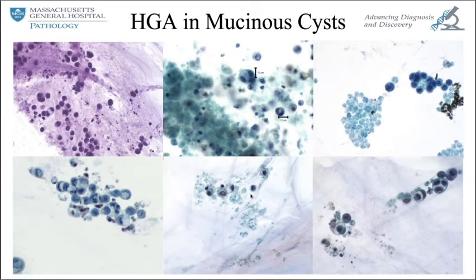What if you have a similar situation to this case that you're showing now? You have a lot of necrosis in the background, but maybe you don't have this many cells. You have a few of these cells. Where would you classify this? Would you just call this a mucinous cyst with atypia, or how does necrosis ever hold value? Yes, it does. It holds value in putting it in the high-risk category.